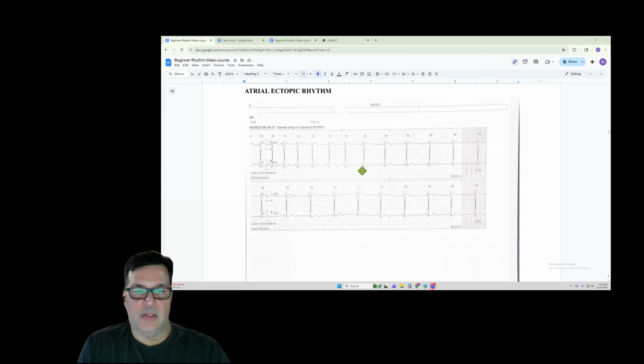But again, look at lead 2 and look at the morphology of the P wave. You can see right here it changes. So this one over here is still positive, but it's a little bit on the shorter side, a little bit more rounded. These two are totally different. You see that? Do I need to blow it up for you? Oh, no, I see that.